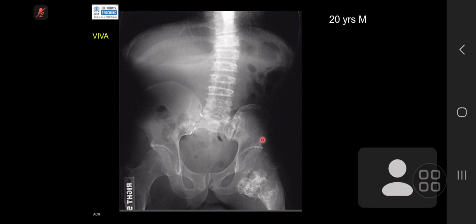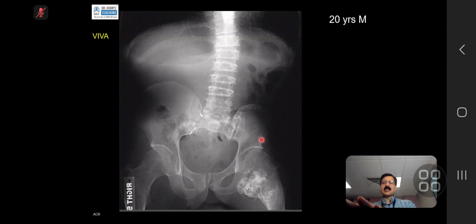Maybe a congenital disease. Okay, fine. So this is a classical story film. This is a classical exam case, a story case. It tells you a story. The story is written there.